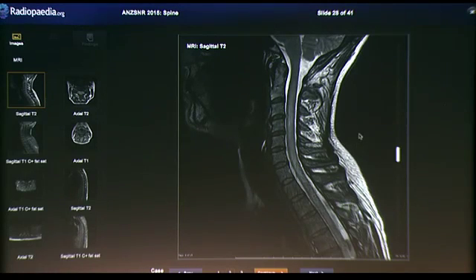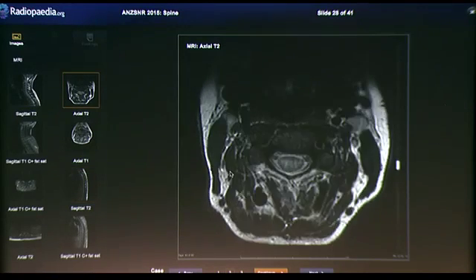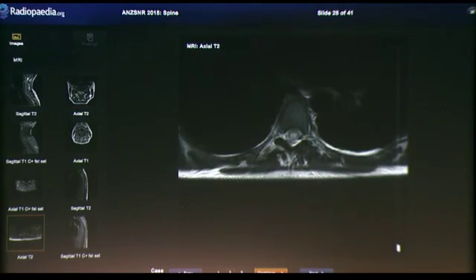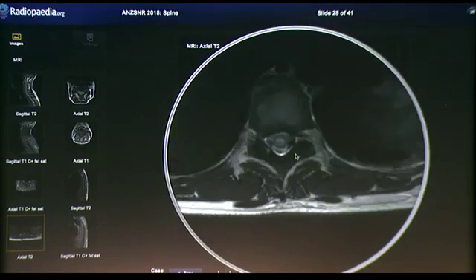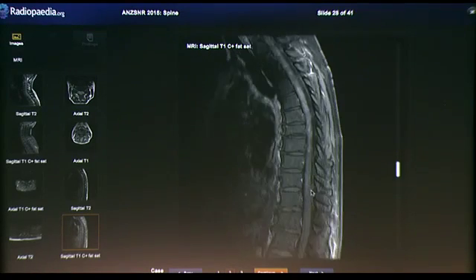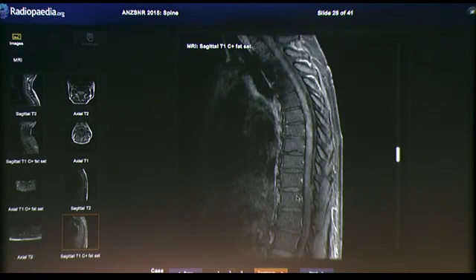And this shows extremely extensive T2 hyperintensity. Basically involves the entirety of the cervical and thoracic spine, which is diffusely expanded. And on the axial sequences, that just shows the extent of the involvement, using more than 2/3 of the cross-sectional area of the cord. And on post-contrast imaging, you can see that there's multiple areas of diffuse and patchy enhancement. No leptomeningeal or nerve root enhancement. So this is kind of your archetypical longitudinally extensive cord lesion.